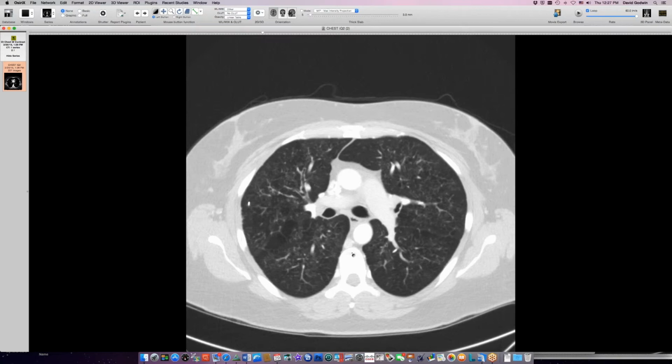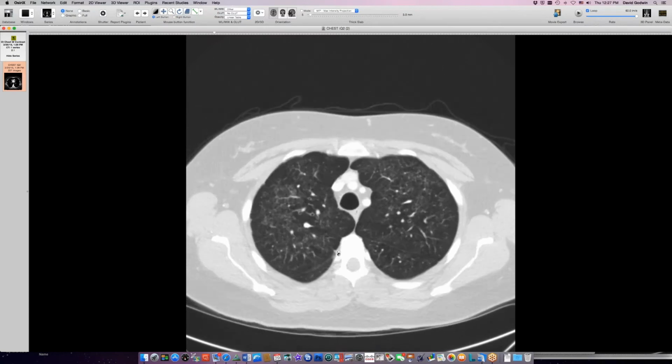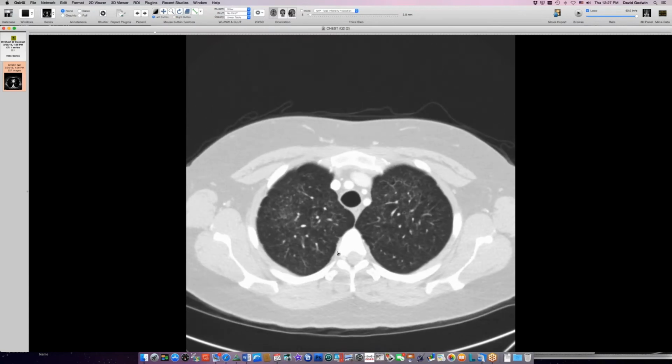Langerhans cell histiocytosis. So that young age is suggestive to me that that's a possibility, but in a cigarette smoker, it's probably variable how much cigarette smoking is required to do this. She's also used marijuana and amphetamines and alcohol, so it's quite a cocktail. So this pattern of fibrosis, I think, is pretty distinctive for a burned out LCH, and this was stable on CT scans a year apart, again, 10 years after diagnosis.